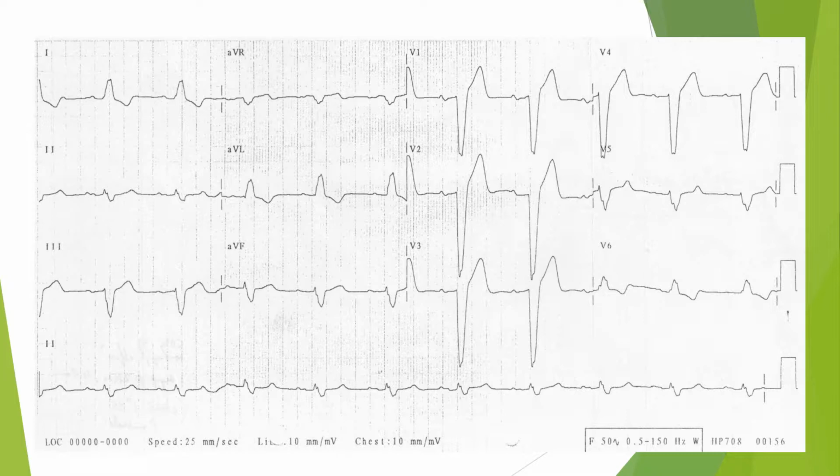And when that happens, what they commonly don't teach you is that when a T wave is on the opposite side, it predisposes that ECG to having some ST deviations. That T wave, in essence, will actually pull the ST segment away from the isoelectric line with it. When the QRS complex is transitioning over into the T wave, you'll get that deviation, and it always will go with it. That's the key to look for.